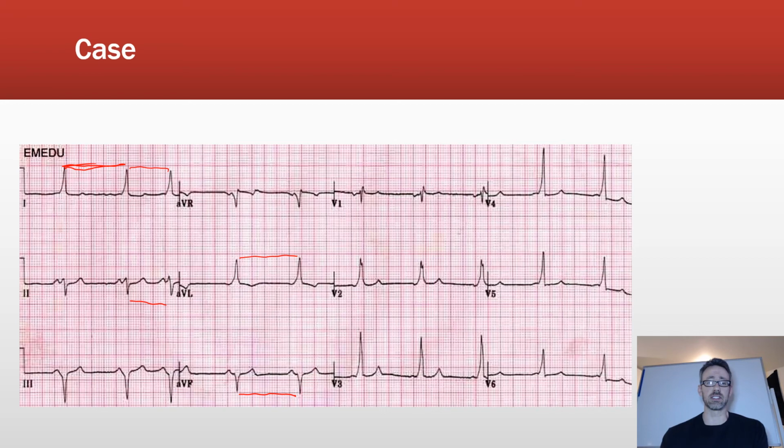So we take a look at the intervals. I want to draw your attention again. If we're looking at the PR interval, the P wave is usually most prominent in lead 2. So let's just look over here. All right, this is actually a very short PR interval.